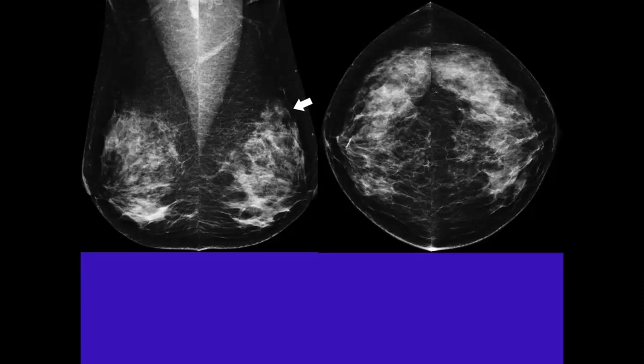And in the CC? The lateral and the superior part also. The superior posterior part of the breast is expected to be missed in the CC view, and the most superior part of the breast, even central, might be outside the field of view.